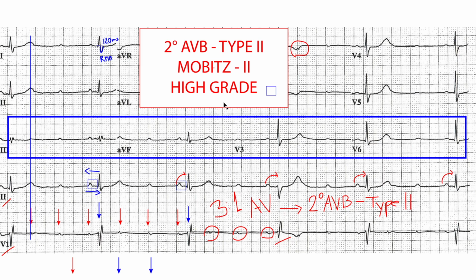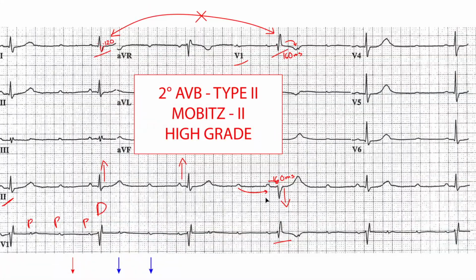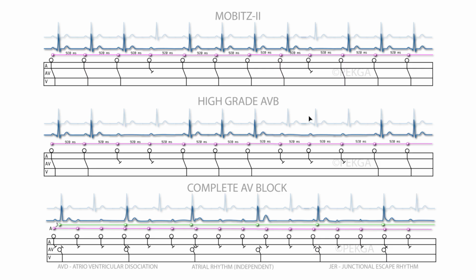Now, I'm going to bring this back down. Sorry, I am jumping in. I'm making a little cutout here. I forgot to mention this. I had this up here, and I really wanted to use it. So I want to cover this. So, this is a graphical representation. This is computer generated, right? This is not real, but it is based on real ECG data.